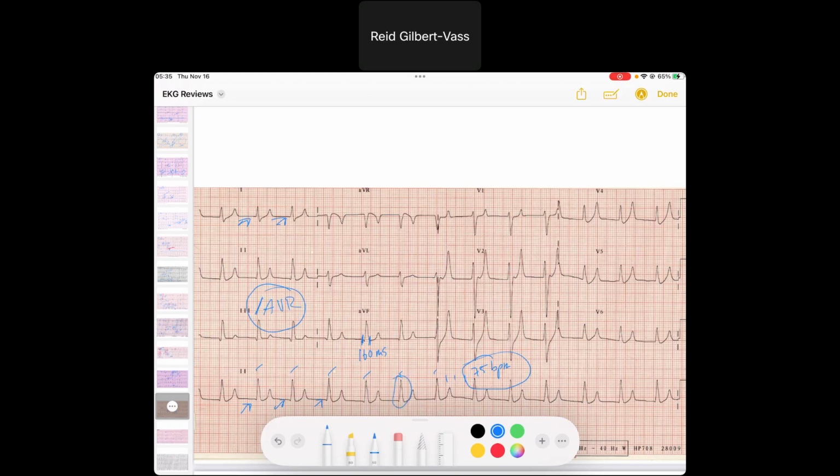These are ventricular QRSs. And if you look at the rest of the morphology, you might notice there's some T waves. The area under the curve of these T waves is very narrow, and they're much higher relative to the QRS than we would expect. And so you might think that this person has hyperkalemia, and that could be the cause of this arrhythmia.